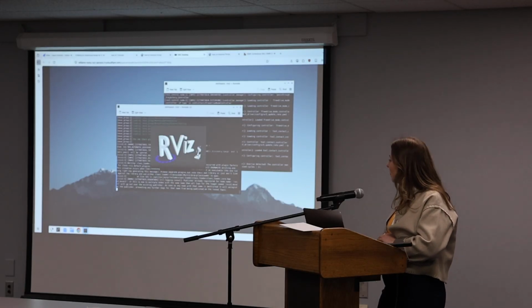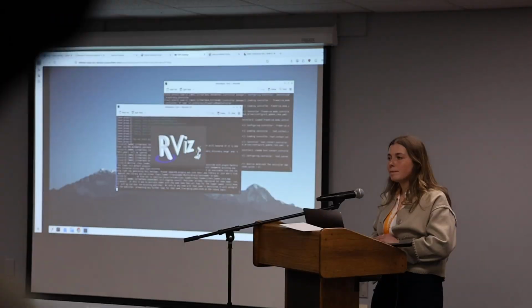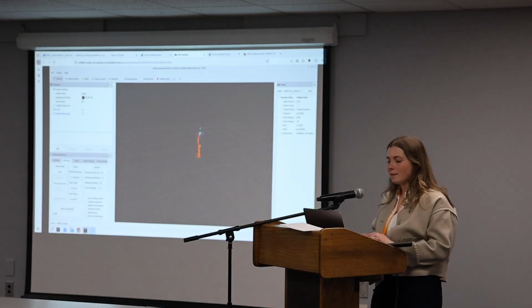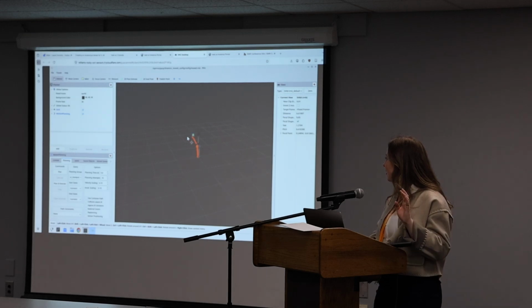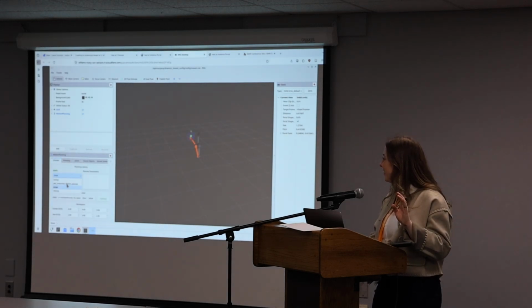So Kelly, did you have the same problem and then solve it by doing that? I'm on my personal hotspot, so I don't think I have any crosstalk. Okay, you should be seeing this little robot move around. It looks like it's working. Oh, good. And did you try that one? Set this to chunk, and it should still work. If it's working, that's good.